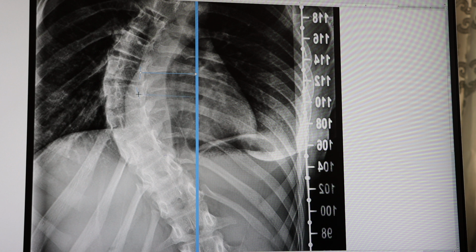Again, do the same for the other vertebra. And the one which is longer is representing the vertebra that is farthest away from the central sacral vertical line, and thus the apical vertebra.